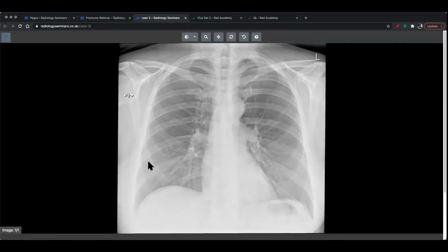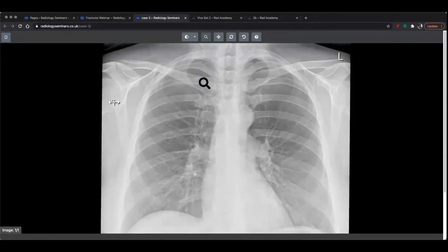Now, case number 3, maybe someone sees it quite quickly. The trained eye might see it, okay? But let's just say we haven't seen anything abnormal. Let's use my check things, right? Number 1, the check thing was the lung apices, yeah? The next thing was the mediastinum, the costophrenic angles, behind the heart, under the hemidiaphragms, and then yes, we do check the bones.